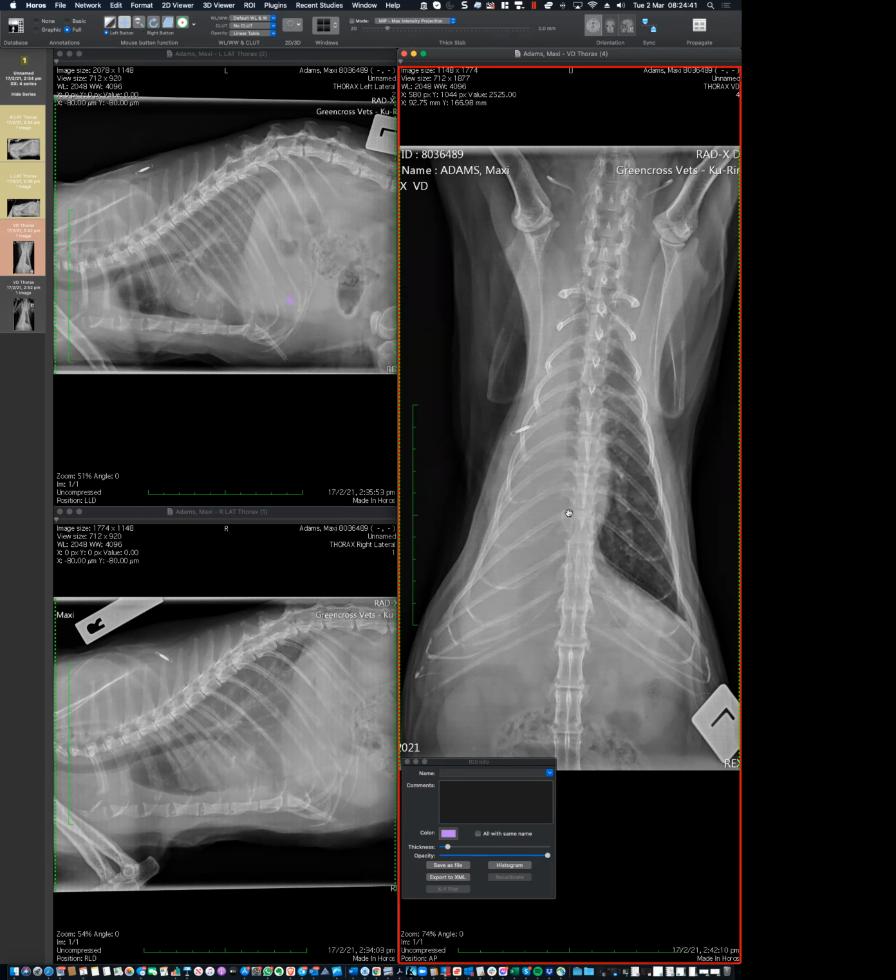I can't. I'm sorry, I'm not familiar enough with this. I can't do it. I've just tried, but I can't. But tell me if it's the right or the left. It's at the left lateral.